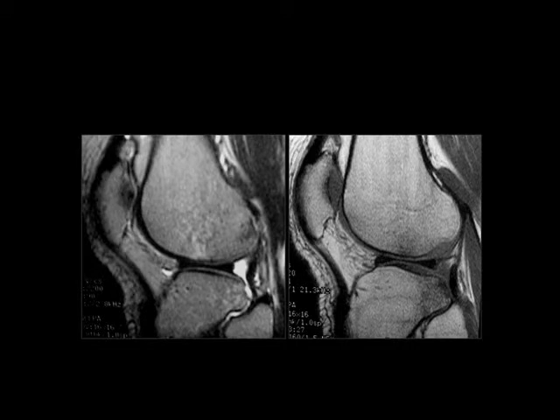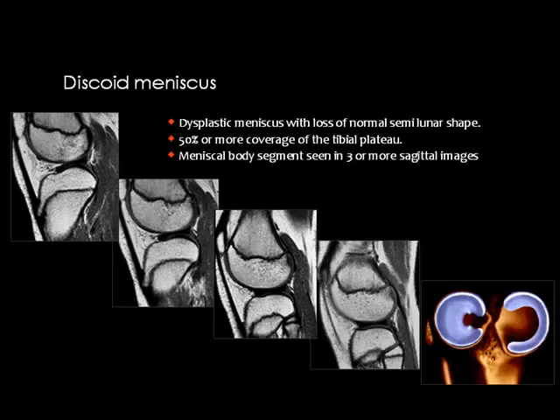It occurs on the medial aspect only, because the medial meniscus is firmly attached to the capsule. But on the lateral aspect, the meniscus is loosely attached to the capsule. Then normally you will see fluid at the base of the lateral meniscus. Normal. This is not a meniscocapsular separation. But if you see fluid on the medial aspect, this is meniscocapsular separation.